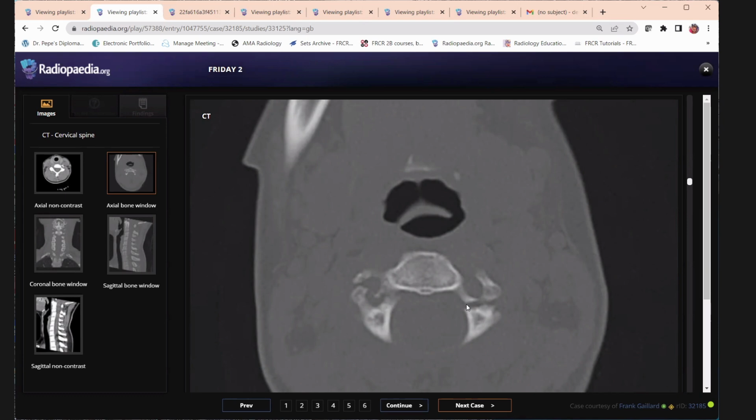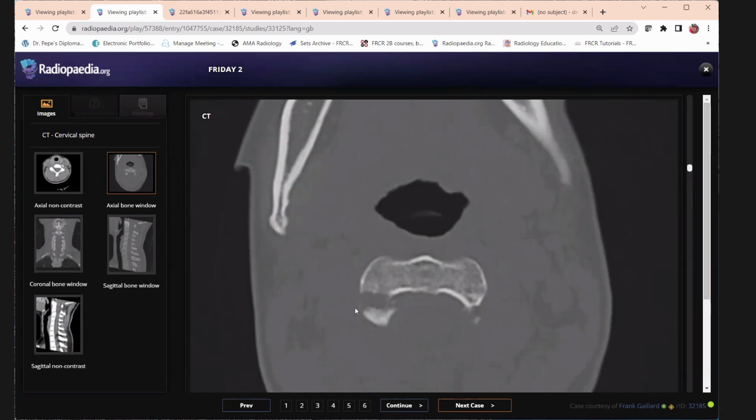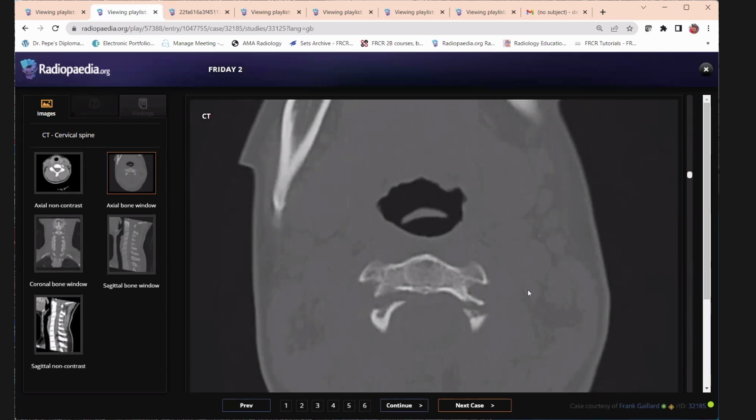So here you did not ask for a CT, so I did not show you. Can you see there is a right-sided foramen transversarium fracture, as well as this side of the posterior facet is impinging inside the canal, so it becomes unstable. Had it been only a fracture of bilateral pedicles or lamina, then you would not have called it unstable. It would have been managed by immobilization only.